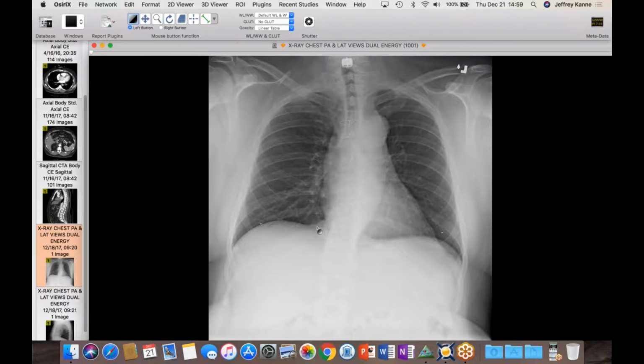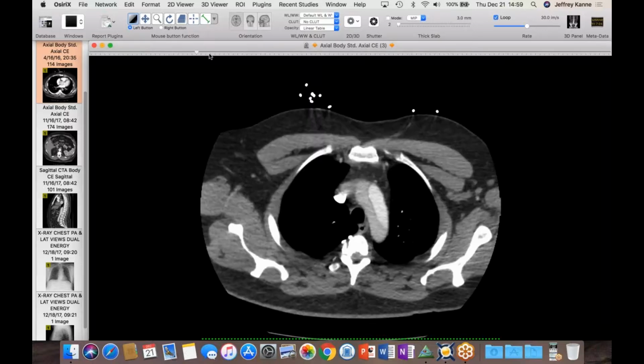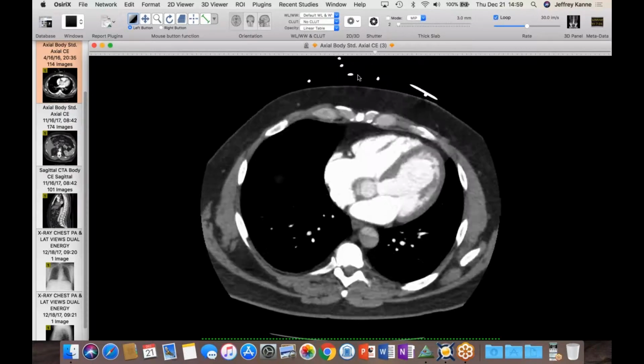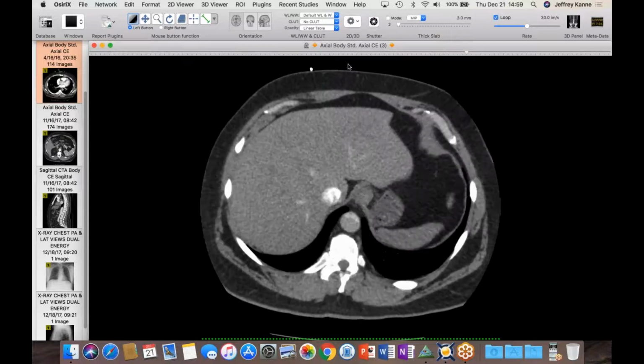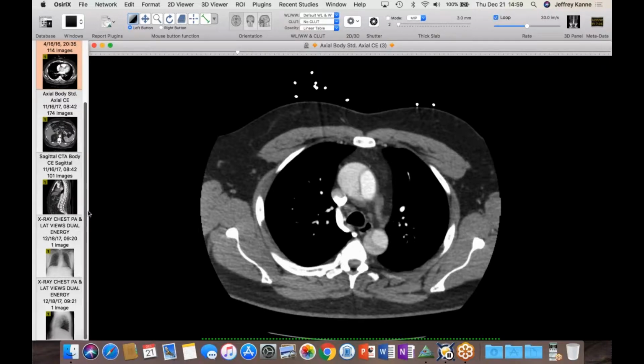It's a nice case where the lateral is a good case. So this patient has a history of, and I'll start with the old CT, an acute type A aortic dissection. Nothing special about it. Looks like a typical one. So the patient was repaired and had an ascending graft placed. And then this is a radiograph.